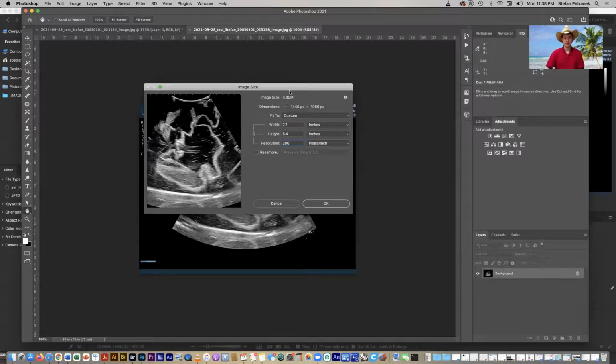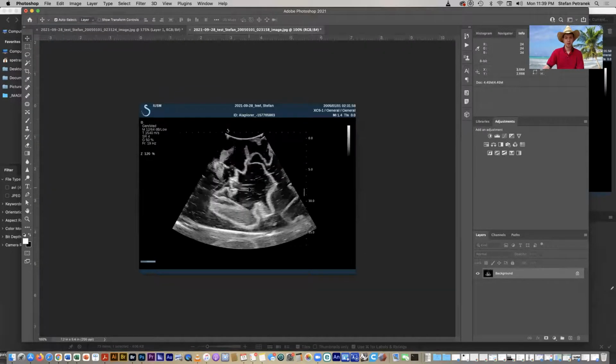And you can see that my image size here is now just 7 by 5, so a little 5 by 7. So if we wanted to increase that in size, you could do that. I just want you to be aware that these are overall low resolution. You can look at the pixel dimensions up here as well, or you can actually switch this over to pixels once we have Resample back on. You can switch that over to pixels so you can see what it's at. I'm going to keep it there.